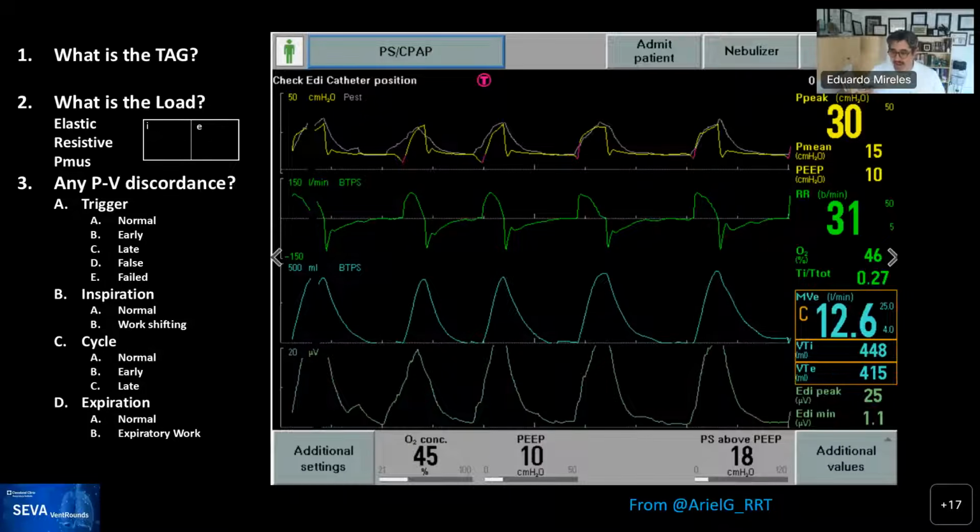Very good. So I'm seeing some of the data that is coming in. All of you are recognizing initially a pressure control, meaning that the pressure is being controlled. We know that because if you look at the flow, remember when you're controlling pressure, I always start by looking at the flow. That helps me recognize the mode faster. You can see rapidly that the flow between each one of these curves is very different amongst them, and the inspiratory times are also pretty different.